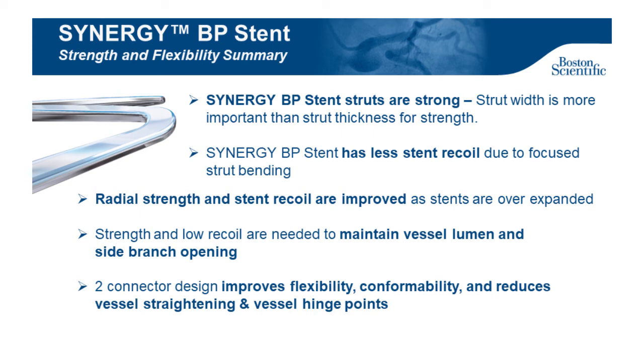Synergy BP stent has less stent recoil due to focused strut bending. Radial strength and stent recoil are improved as stents are overexpanded. Strength and low recoil are needed to maintain vessel lumen and side branch opening. Two connector design improves flexibility, conformability, and reduces vessel straightening and vessel hinge points.